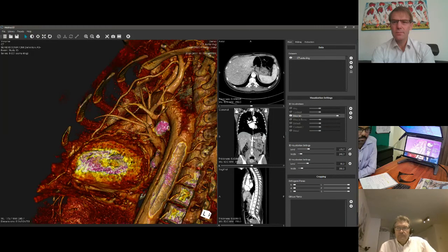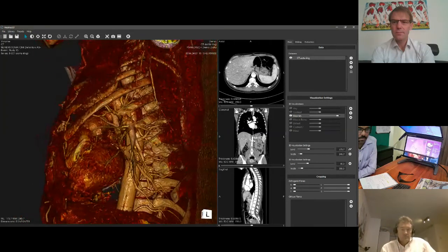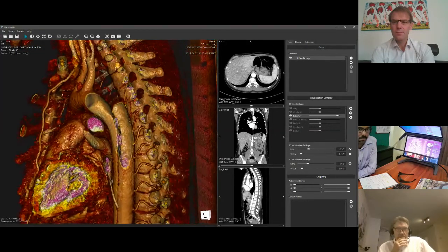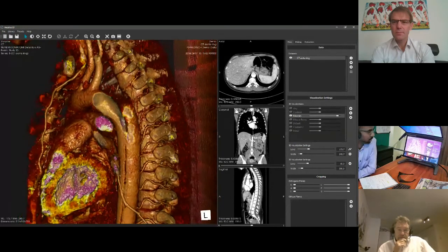Well, I'm working behind my laptop. Unfortunately, I don't have the PluraView at my disposal at this moment to work with. So now, if I'm doing this using the PluraView, it's even 100 times easier. So here you see this little rupture, you see these vessels coming out, and you can immediately see and understand the anatomy of this specific patient. Finding out that these vessels are coming from the false lumen using a 2D scan is virtually impossible.